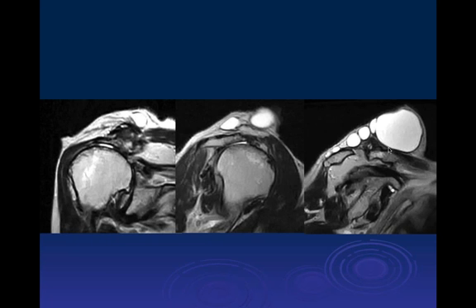And what I'm also seeing is significant osteoarthritis with superior, basically the humeral head. I mean, there's no more articular cartilage in the humeral head. It's essentially touching the inferior surface of the acromion. So this kind of superior ascent of the humeral head is due to the rotator cuff being completely torn.